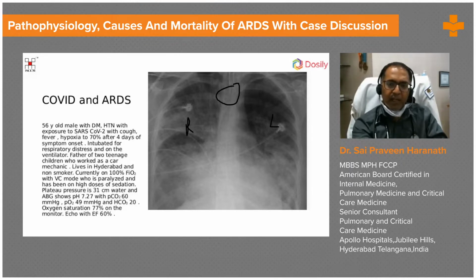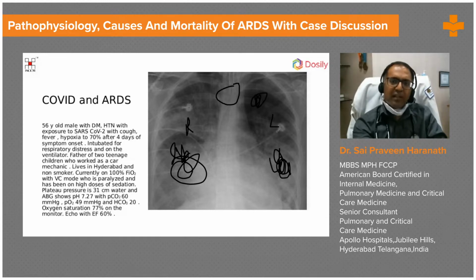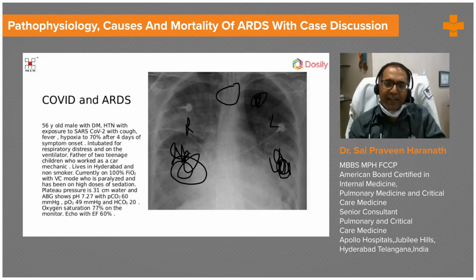You can see the cardiac leads on the surface, and you can make out all these areas are the whitish stuff. This is what is called ground glass changes. The black stuff up here is actually the ventilated lung.